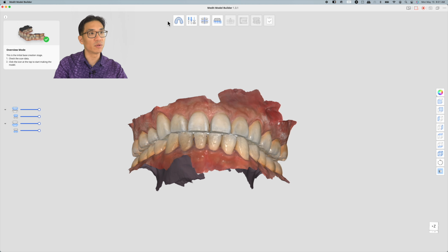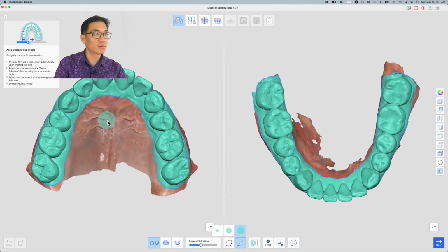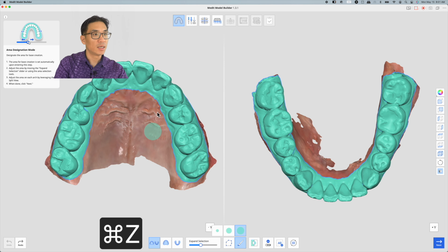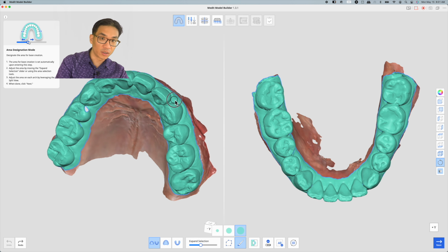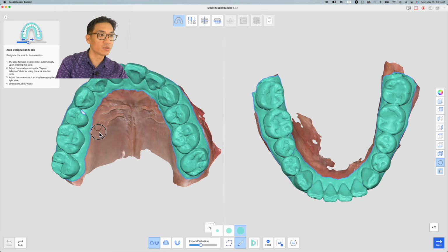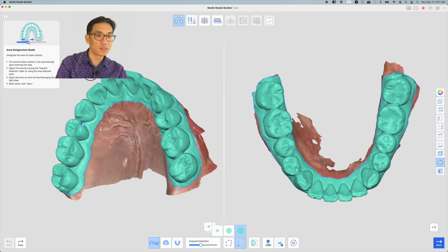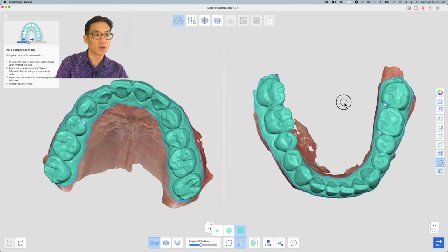We start from left to right, so I hit left, this one here. Let me undo that. If you want to move around, you have to click this circular arrow button here and take a look. This is the information that I want to make a model with.